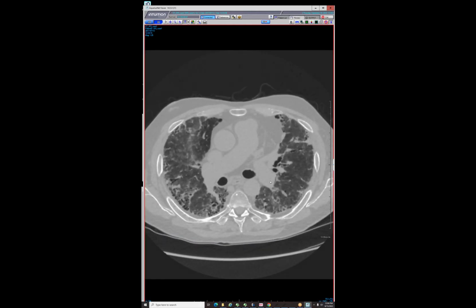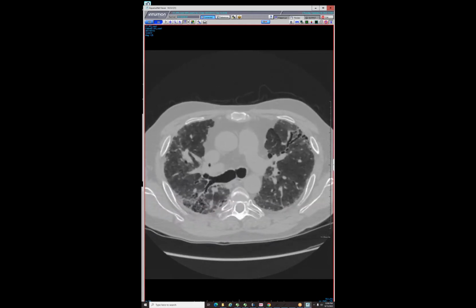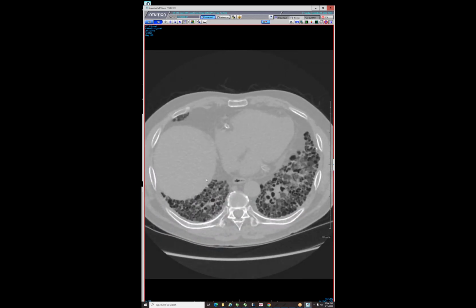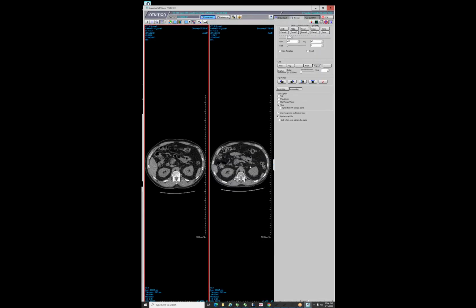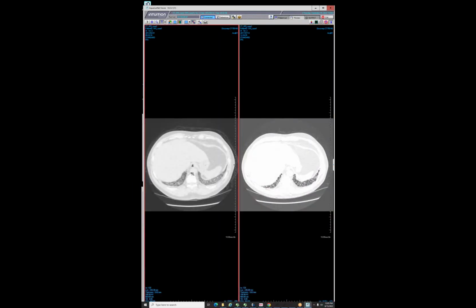With this whole naming thing, maybe people would say, well, given the amount of ground glass, it's inconsistent with UIP. And that's what drives me nuts about the whole thing, because it is UIP. Anyways, I don't think I've seen a case of such profound transformation from a NSIP pattern that's been path proven to a UIP pattern that's been path proven. I don't know what other people think, if they've seen that. I have cases where I don't have path proof, and I can say, well, maybe it was UIP the whole time.